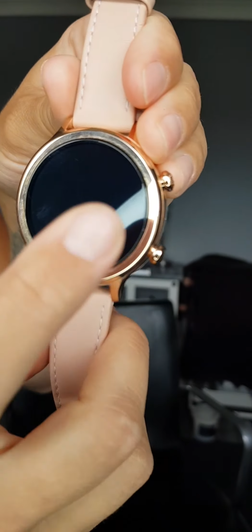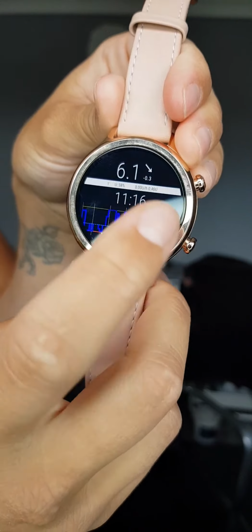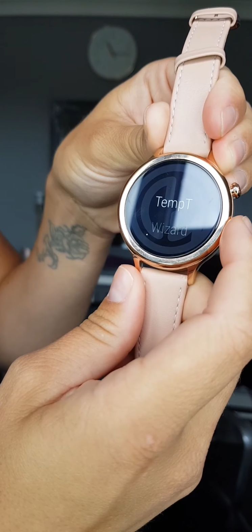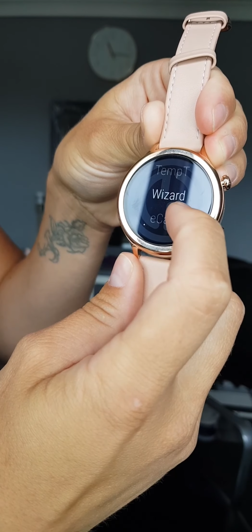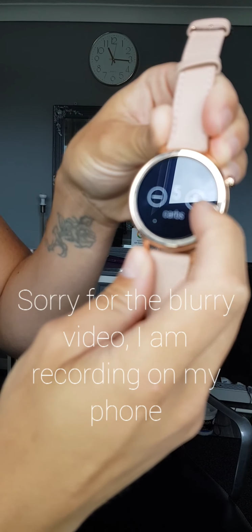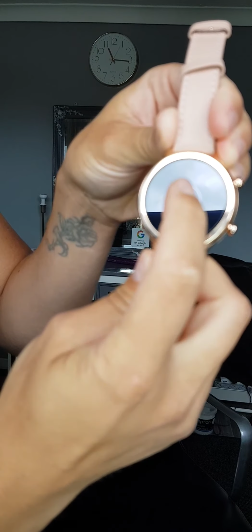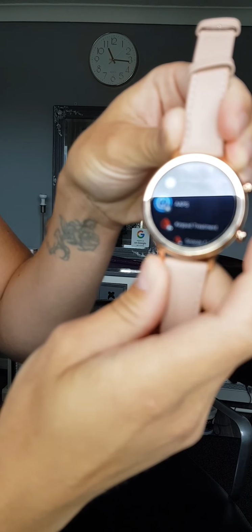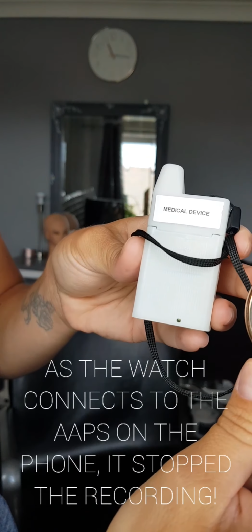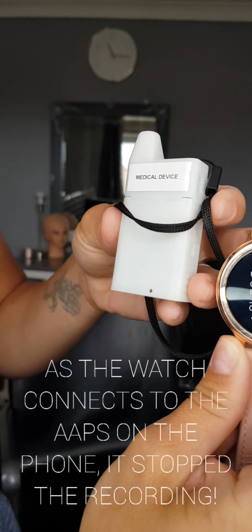One other thing that I have done is I've linked my smartwatch, so I can actually go onto the smartwatch and it will give you options. You could go into the wizard and tell it, I'm going to have a biscuit. And then that will connect to the Riley, and it will give me a calculation.